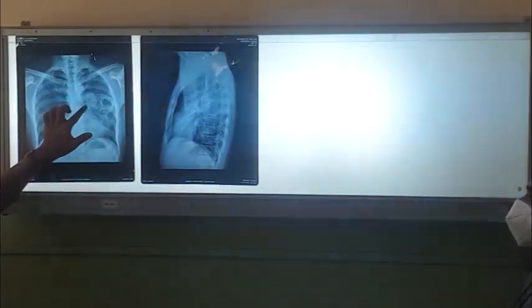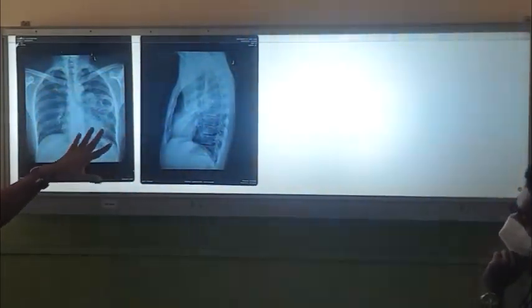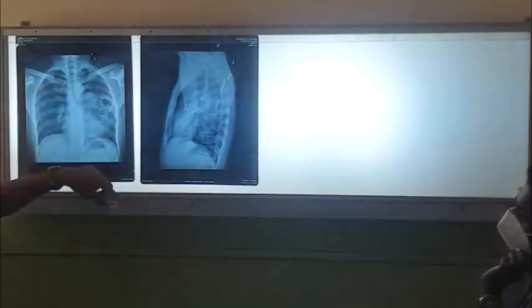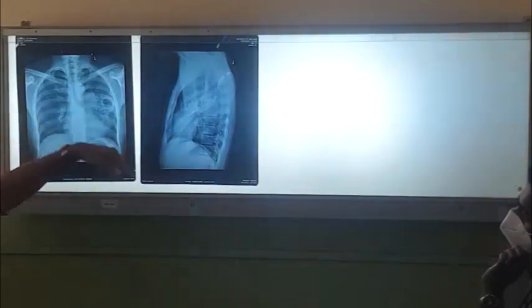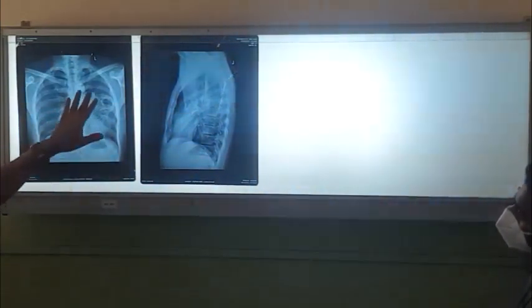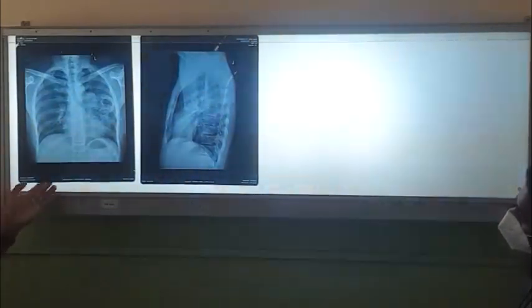So what has happened here is, we did bronchoscopy and looked at the lingular lobe entrance, and there was a mass blocking the lingular lobe, causing distal pneumonia. So it's a secondary cavitating pneumonia due to this mass lesion obstructing the lingular lobe bronchus.